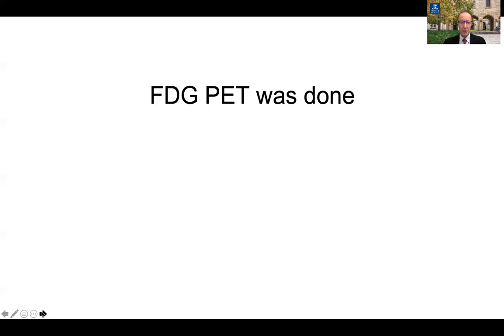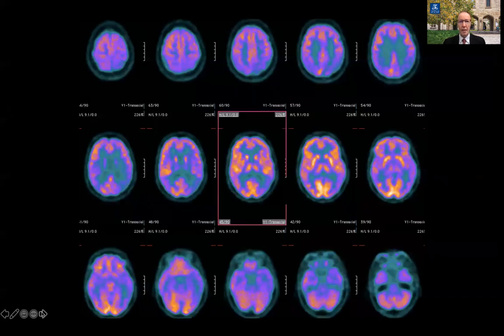An FDG PET was done. Here it is. I'll give you some time to have a good look at it.